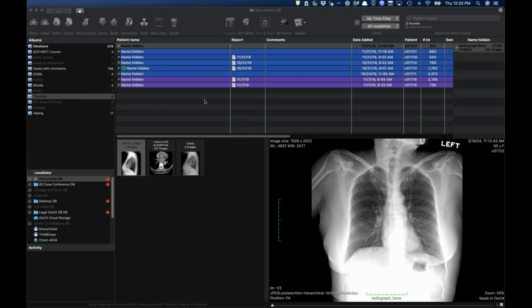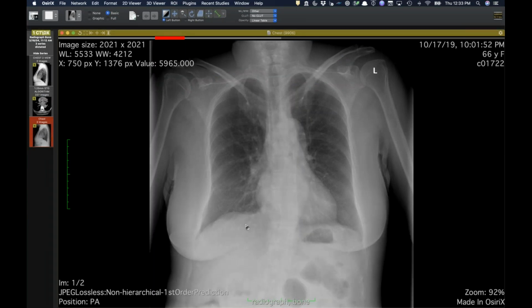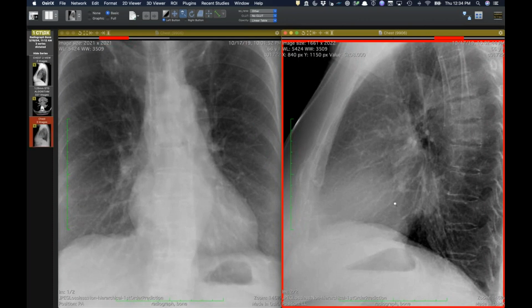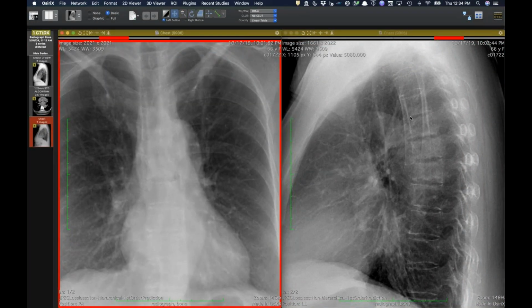All right, this first one is an interesting one I saw the other day, and it's a little bit of an eye test on the radiograph. I'll show you guys the PA and the lateral view, and you can look for a second and see what catches your eye. Anyone? Can you zoom up, make them big just for a moment? Look in those vertebral bodies, just below the aorta.